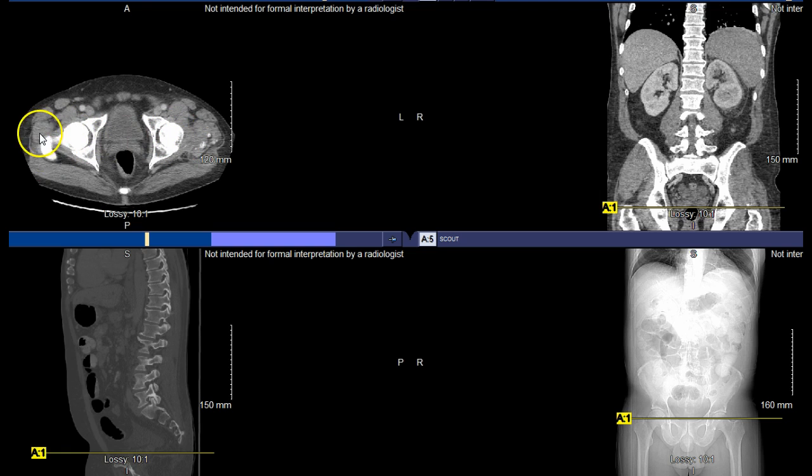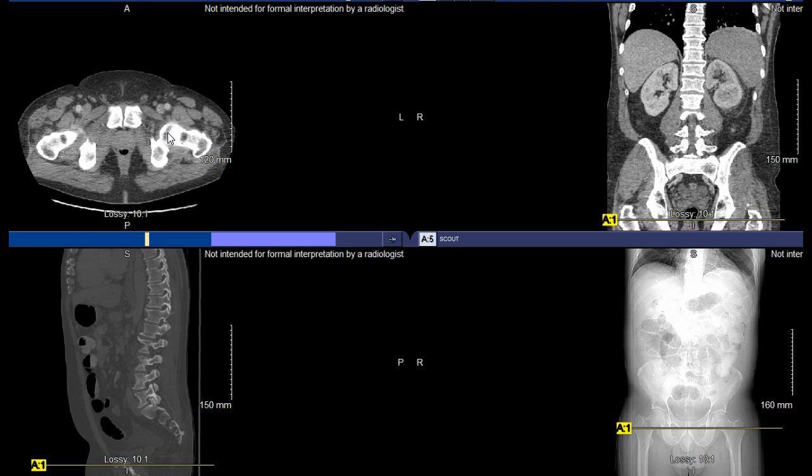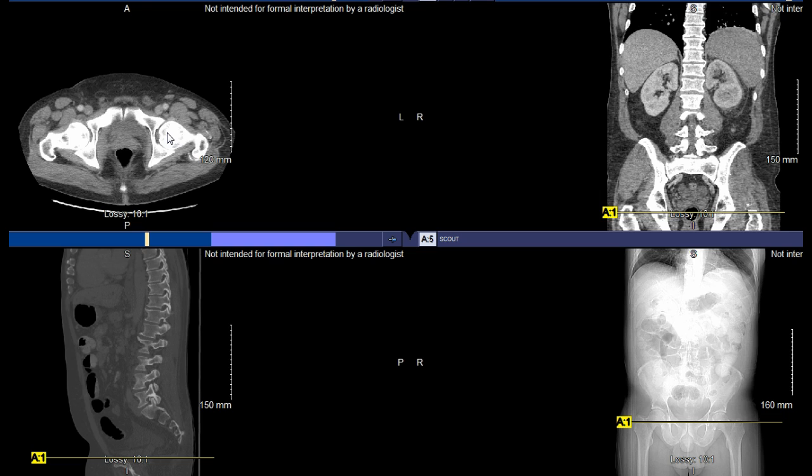So femoral head, you can see a portion of the greater trochanter, and you can see the neck. The patient isn't perfectly aligned on the table by all means, and we're not seeing those symmetrical appearances of structures, but nonetheless you can see those structures. And the other structures being demonstrated here, you can see the symphysis pubis on the anterior side here.